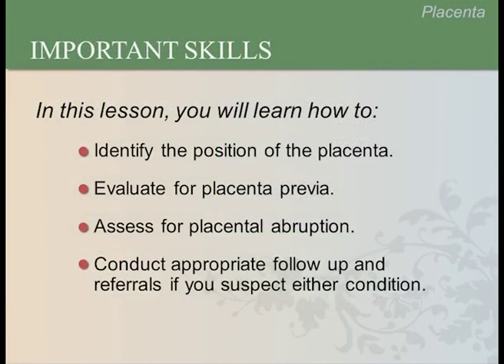There are 4 main skills you will learn in this lesson. You will learn how to identify the position of the placenta, evaluate for placenta previa, assess for placental abruption, and conduct appropriate follow-up and referrals if you suspect either condition.